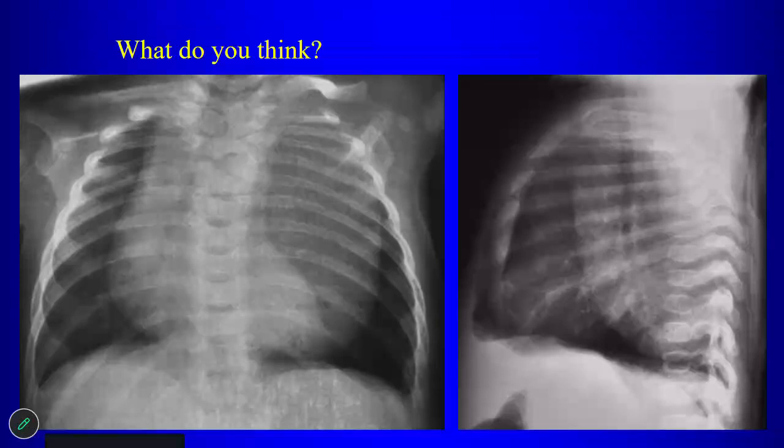Maybe it's just like normal thymus. The thymus? So this is in the posterior mediastinum. Is that what you would expect for the thymus? Never mind. Sorry, no, that's the spine. Well, what do you think of the spine? Notice anything about the vertebra?